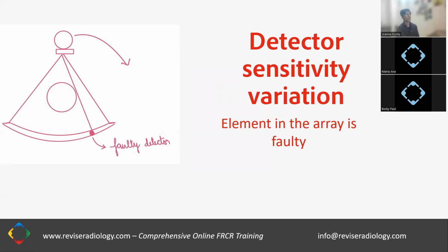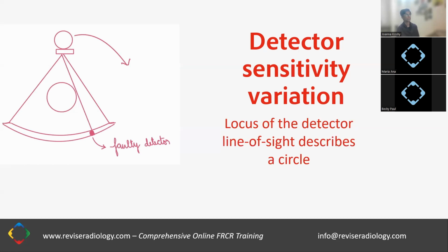And what we need to realize is that the locus or the line of sight of the faulty detector, as the X-ray source rotates, is in the form of a circle. So this either happens when an element in the detector array is faulty, or when the detector gains are out of adjustment. As we were saying, the locus of the detector line of sight describes a circle. This is to do with the fact that the scanner gantry is rotating.